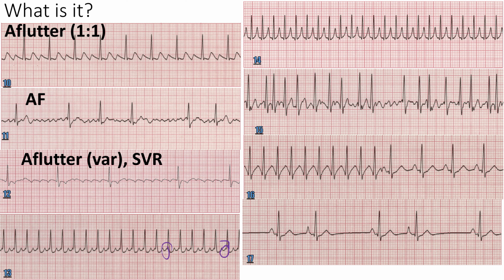Let's say that that's actually, and again, that's why you do a 12 lead to see if it's really this or not. Okay, so the blood pressure is greater than 90 and they have this rhythm. What can you do about it? What would you expect to be done about it? What is that?